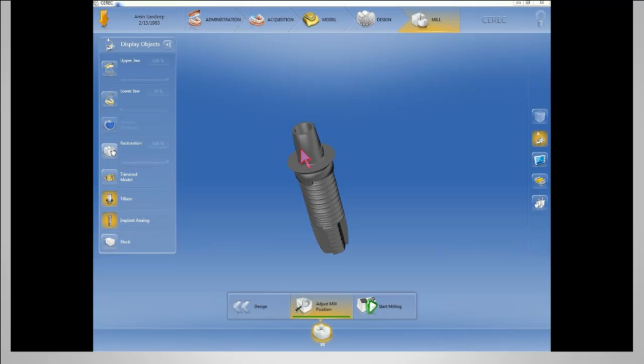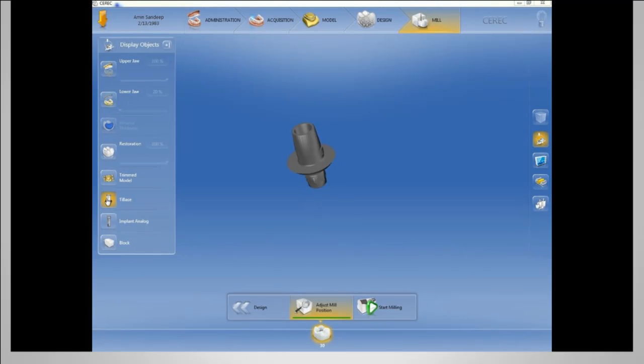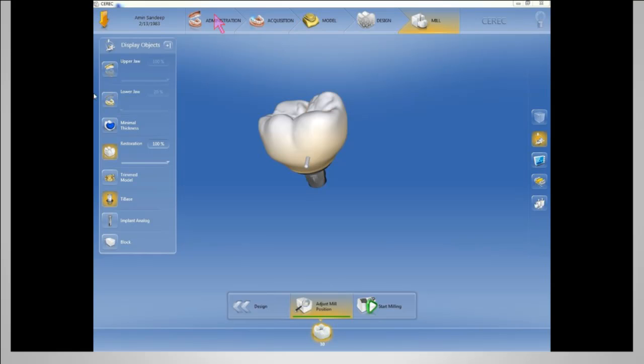Here's what the tie base looks like, along with the location of the implant. Here's the tie base by itself. And here's how the restoration would fit the tie base. Once this crown is manufactured, it has to be fired, and I'll share with you how we can actually attach this crown to our tie base. Once these two components are glued together outside of the mouth, it can be delivered as a single prosthesis as a screw-retained hybrid abutment crown.